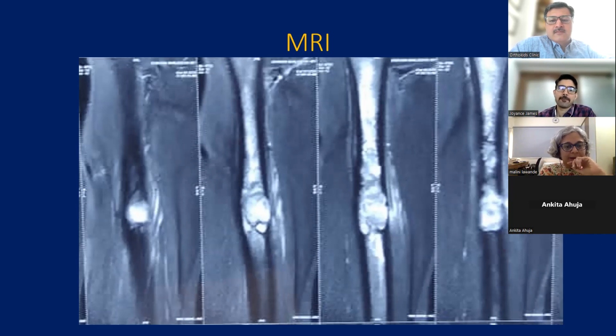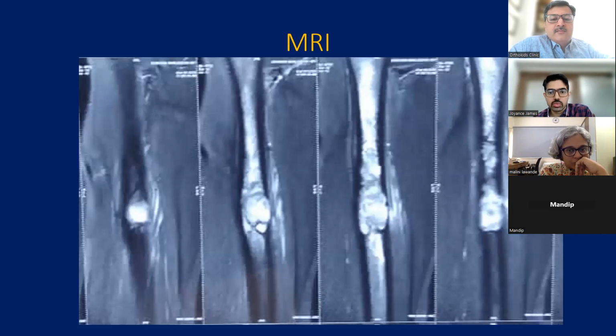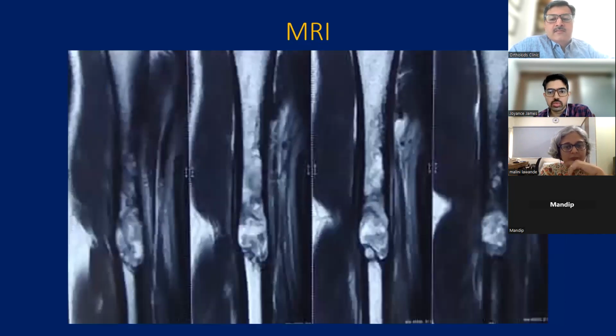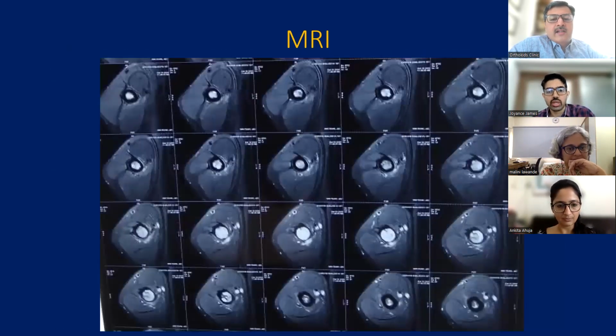But this edema could also be because of the path fracture. Yeah, edema could be because of the path fracture, because the appearance itself is more like a fibrous lesion. Do you have another image, Johannes? What I was wondering is, do we see some fluid levels on that T2? It was not very clear on the first image. We need to see the axials. Otherwise, it could be a fluid ABC transformation in an FD which had fractured. Johannes, can you show the axial? We have.